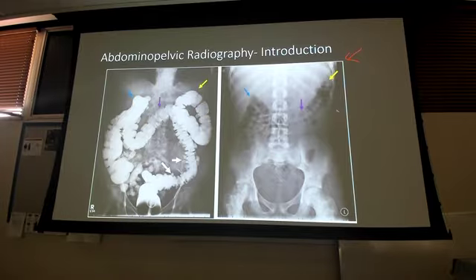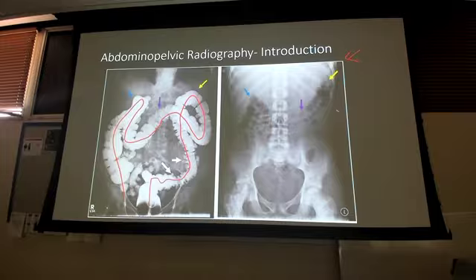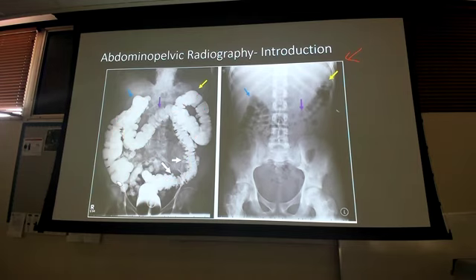This here is a barium enema. This is where we put contrast up in here, rectosigmoid, descending, splenic flexure. Look at this shape. Transverse, hepatic flexure, down ascending. So it's not always this perfect little kind of shaped guy that we see in the anatomy, right? How do I know this is large bowel and not small bowel? Well, a couple of reasons. One, it's a barium enema. I ordered it and we're doing it. So I know that because that's where I put the contrast.